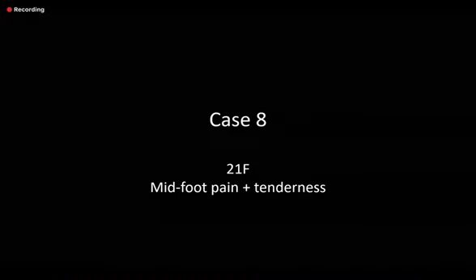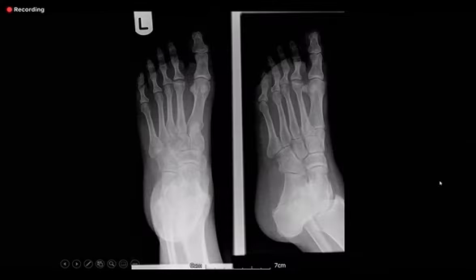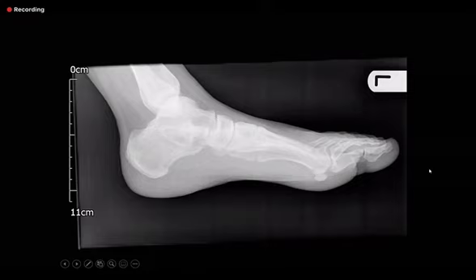Okay, let me give you the last case of the day. 21-year-old female, mid-foot pain and tenderness. Next film, please. I think I lost the control to, oh, no, sorry, I do have it. Please go back. Go back. Yeah, just stop here. This is your first film.